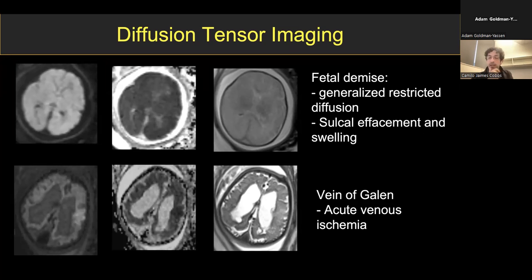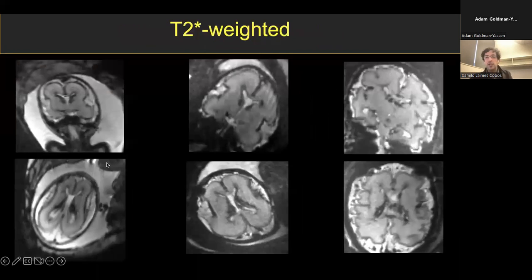And what we documented is that if we see acute areas of injury with restricted diffusion, in every single one of those fetuses the injuries progressed, and either on a repeat fetal MR or a neonatal MRI, the brain has basically washed away. So we are using it to screen for acute injuries in these fetuses, with the idea that it is a very powerful prognostic indicator for the neurological prognosis of that patient.